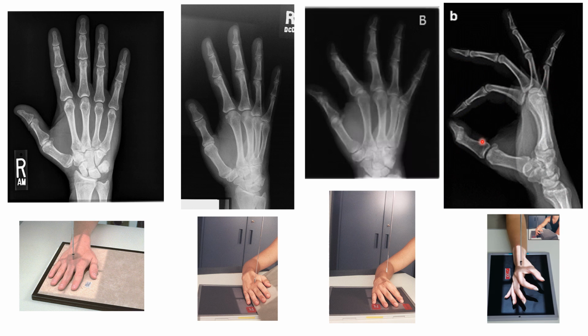Now the next image we're looking at is our lateral hand X-ray. Once again, we can go straight to those metacarpals and see that metacarpals 2 through 5 are superimposed. This tells us that the patient's hand is in a true lateral position with little or no rotation at all. We look at the radius and the ulna to be superimposed distally, and we actually have to have an inch of the distal radius and ulna in this image as well, so we also want those superimposed.